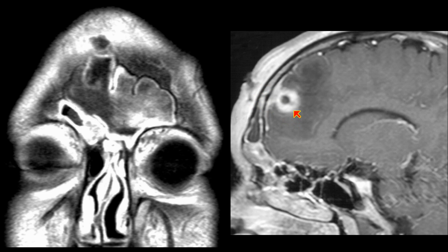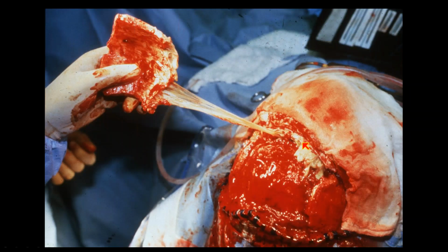And this can be very difficult to take out intraoperatively with that abscess material. This is that patient who had a bifrontal craniotomy, and all this infected fluid was actually holding the craniotomy in sight with this thick, gooey abscess that he had intracranially.